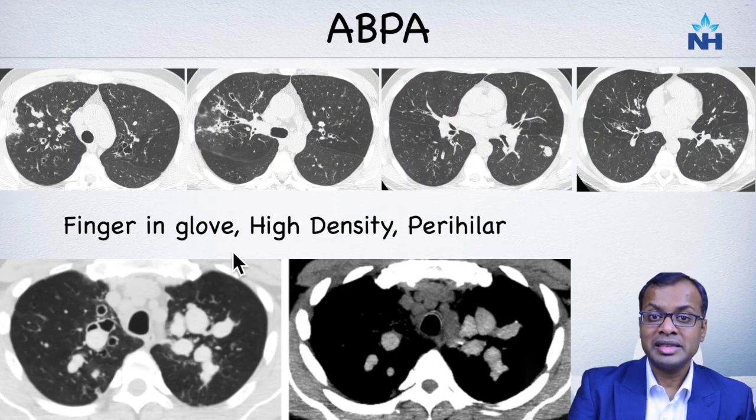However, you may see atypical presentation also, whereby all you're seeing are central bronchiectatic changes in a perihilar distribution with some areas of endobronchial mucus plugging. So if it is perihilar central areas with mucus plugging, especially in an asthmatic, then think in terms of ABPA.